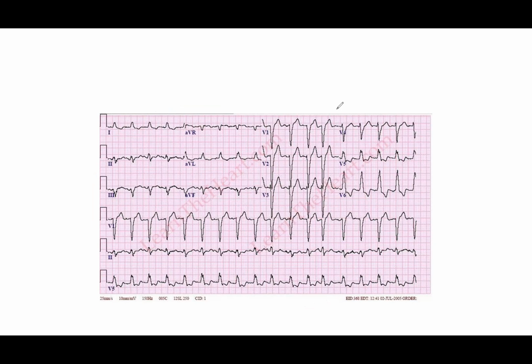Bundle branch block. Yeah, I think I said that right. When you start talking for a living, sometimes you say some crazy things. You're not even sure if you're saying the right stuff. So yes, it looks like a bundle branch block. And we go to V1 to confirm, with lead 1 and V6. And we have a negative deflection in V1, R wave, R wave.